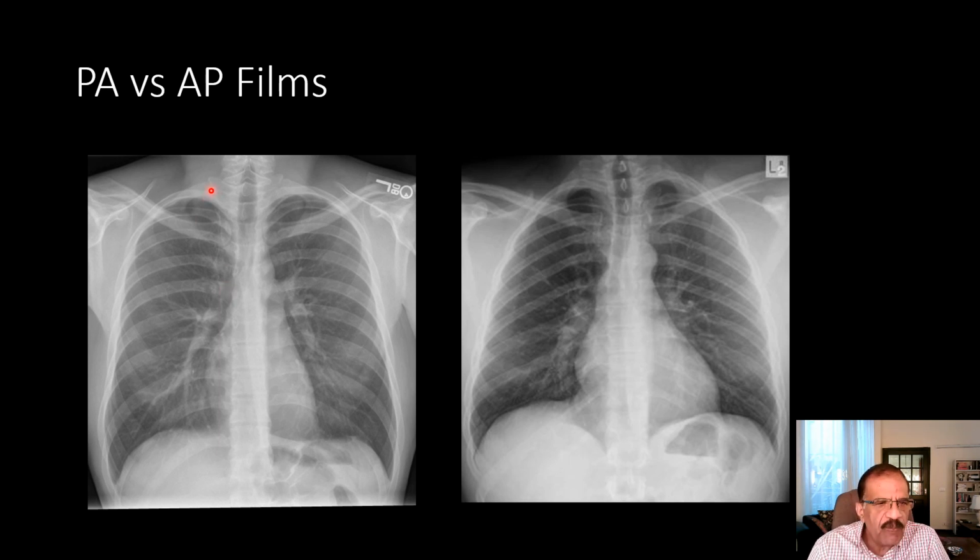And then this is the second, then the third, then the fourth. So you trace the fourth rib, and then you again draw an imaginary line. This would define the lower boundary of the middle zone or the upper boundary of the lower zone. So these three zones on both sides, upper zone, middle zone, and lower zone, are territories, and this concept is applicable to X-ray only. This is not on the human.